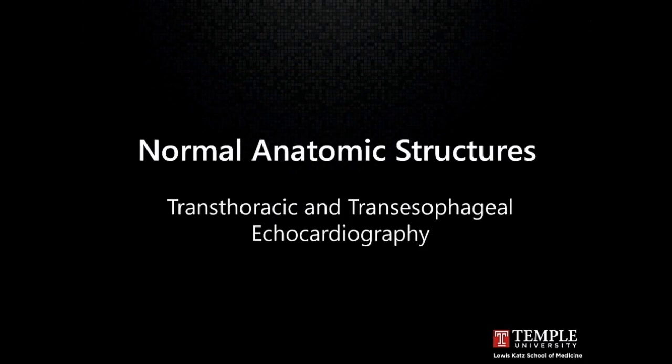So I mentioned cardiac structures. Let's just run through a bunch of normal anatomic structures that we're able to see by echo. And then hopefully we can sort of wrap things up.